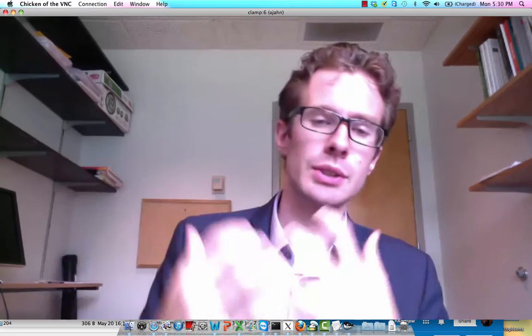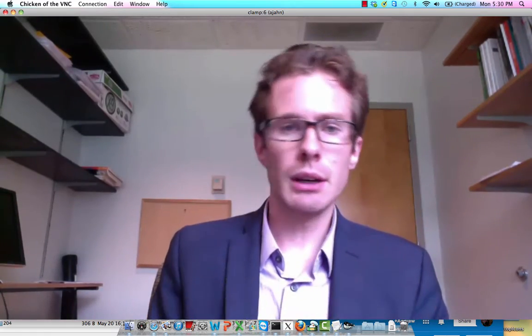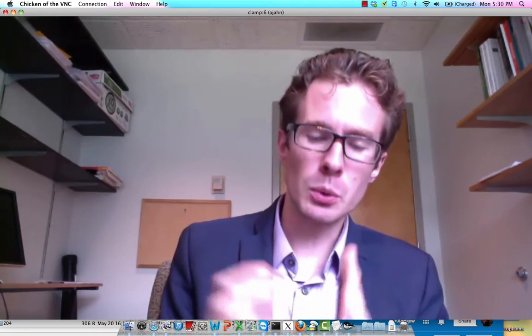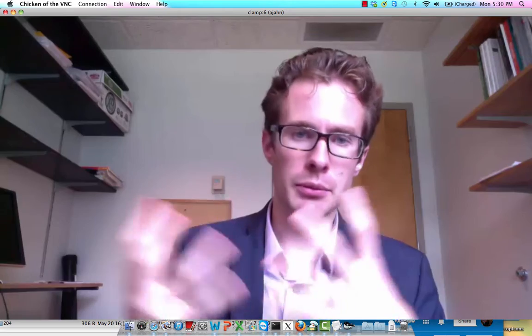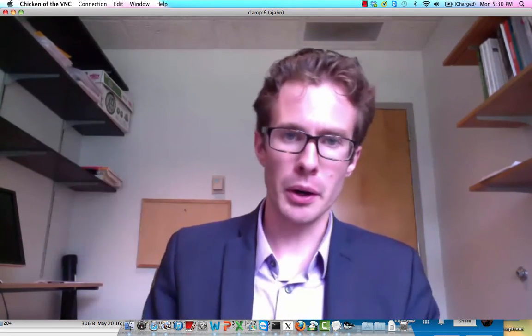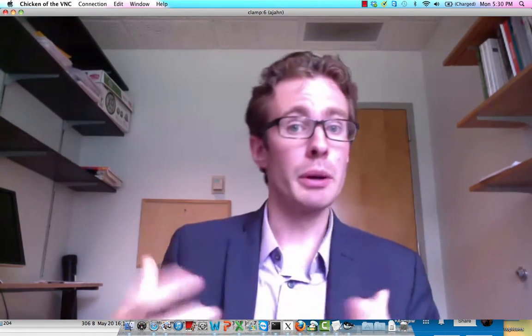Even if you save the whole batch job that you're doing, then reload it, it can still take a long time. It can be difficult to figure out what's going on. So here what I'm trying to do is I've created a small script just to focus on that specific part of the SPM analysis. I hope it's useful. I hope it catches on.